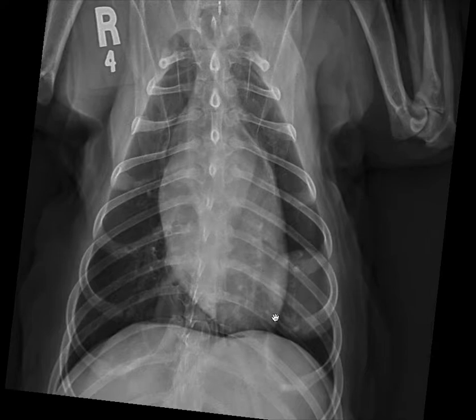This is an example of a case where many of us will be able to see the main finding right off the bat. Remember, in those cases, you have two jobs still left to do. The first job is to use your radiographic skills to determine exactly what this finding is, where it's located, and what it could mean. The second job is the harder part, and that's remember to always look at the entire radiograph.